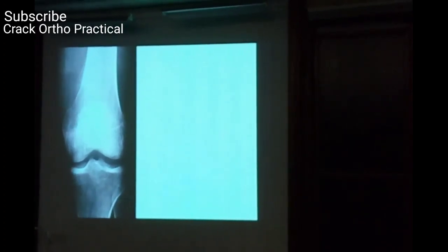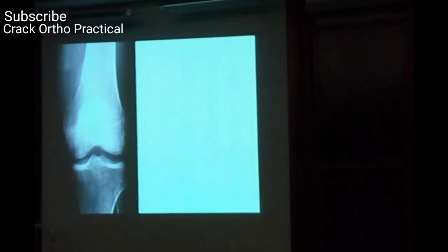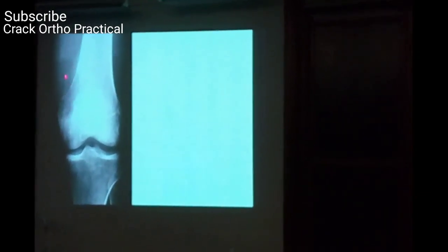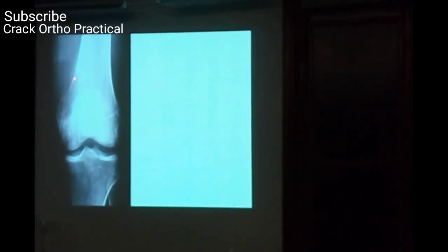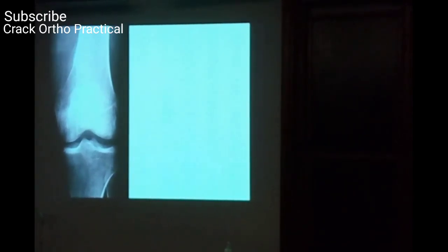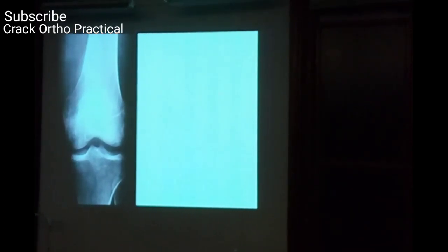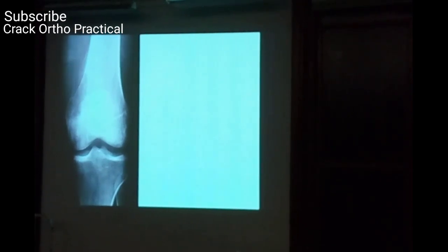The periosteal reaction is not solid, it's not lamellar, it's aggressive and discontinuous. You can see it from both ends, but inside it's not there. Remember lamellar, Codman. There is a discontinuation of the periosteal reaction in the center, with both sides present. The tumor is so aggressive that it has breached and gone into the soft tissue. That's right, so it's osteosarcoma. But which osteosarcoma has this lytic lesion? Telangiectatic. Right.